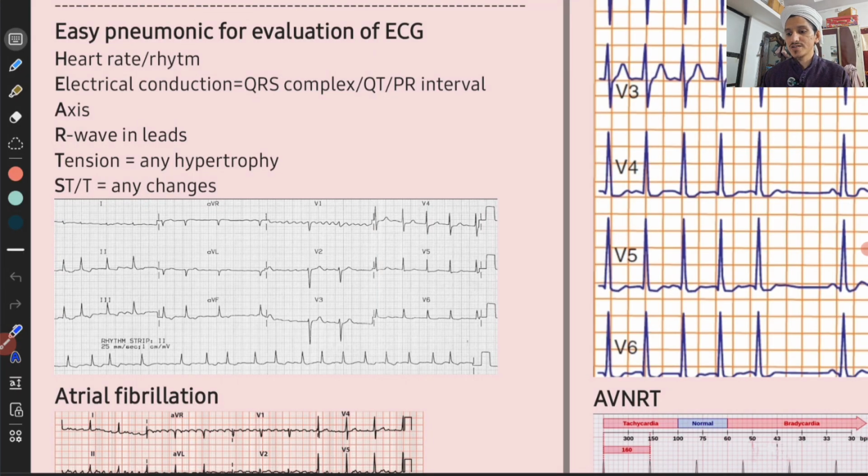I have edited the last video of arrhythmias and have done a lot of research to understand in detail those master flowcharts which I discussed in the last videos about the SVTs and VTs. So it was not so clear. So in this video, we will first learn about some different types of ECGs, then we'll go on to the flowchart so that it becomes easy.